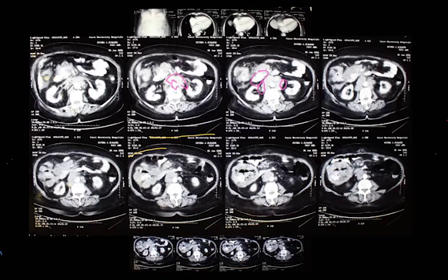What could have happened to the cava? If this is a lymphadenopathy, it may be compressed. The cava may well be compressed. Absolutely. What else can happen to the cava in this situation other than being compressed? It may be displaced. Compressed, displaced, they're two different things. It can be displaced, it can be compressed. Infiltrated, if this is a tumor. Absolutely, infiltrated.